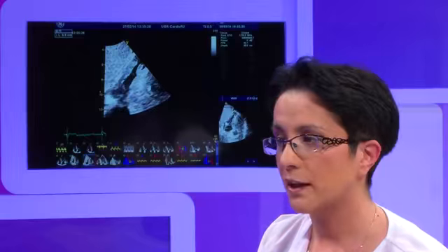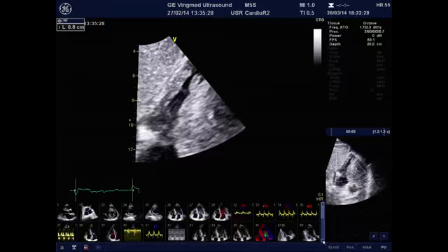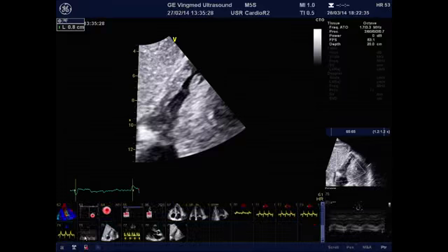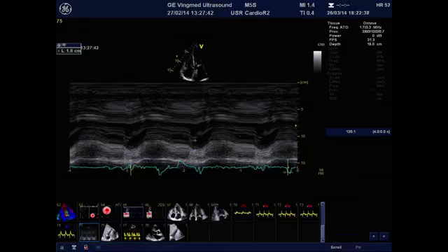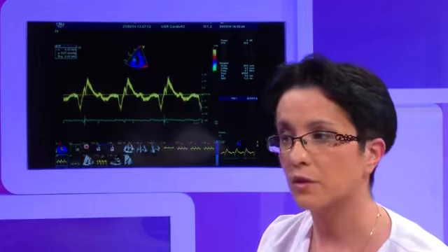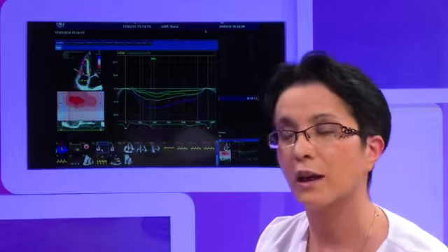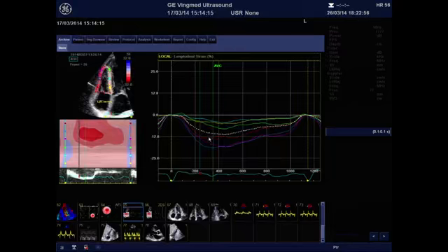Moreover, if we are questioning the function of the right ventricle, apart from the parameters that are conventionally used for that, like TAPSE, which is 18 millimeters, so in the normal range, or the S' of the right ventricle, which is 13, so in the normal range, we could, however, find that there was a level of subclinical dysfunction at the right ventricular wall as well, with a global strain around -13%, mainly due to a dysfunction of the interventricular septum here, but also with low abnormal values of the strain of the right ventricular free wall.